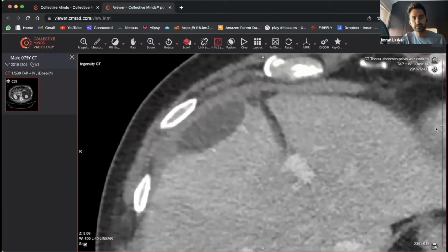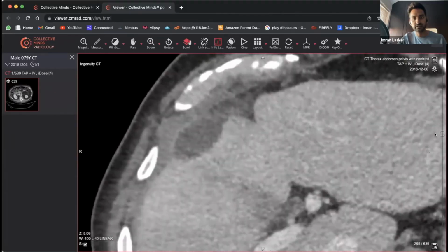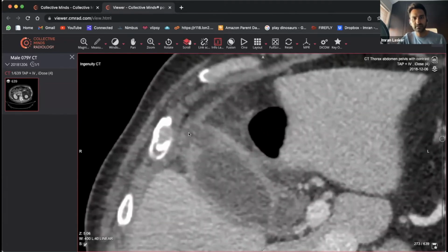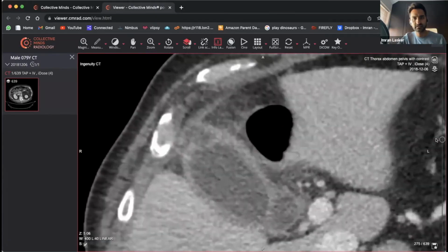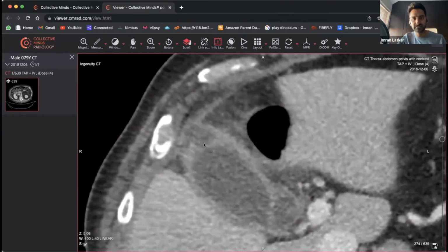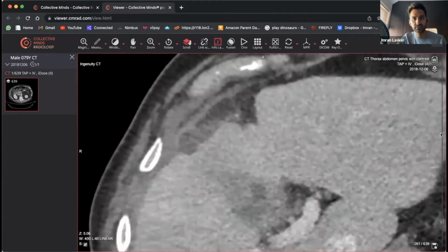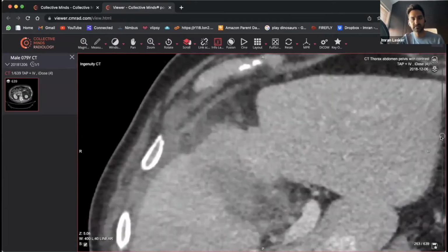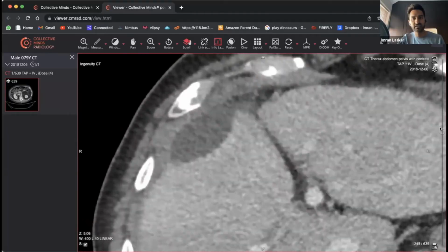So there we go, from the top, down, down, down. And then it looks like it finishes, doesn't it? And then you can see gallbladder wall sitting over here, and that looks almost separate. And then there's maybe what looks like a little tract, possibly coming this way. There could be some sort of defect within the gallbladder wall. Very, very subtle, but there does seem to be a bit of irregularity of the gallbladder wall there, and what looks like some sort of collection, some fluidy thing coming forwards, superiorly and anterior to the liver. To be more specific, we're probably looking at segment 4B of the liver.